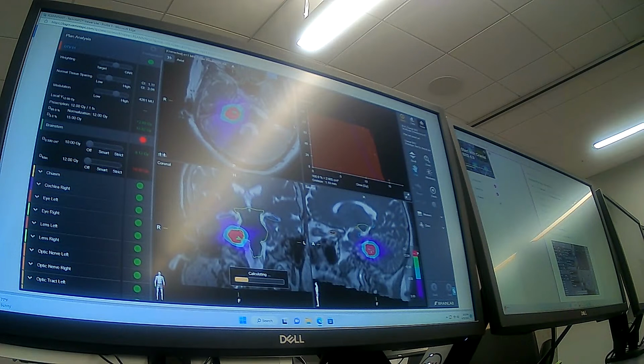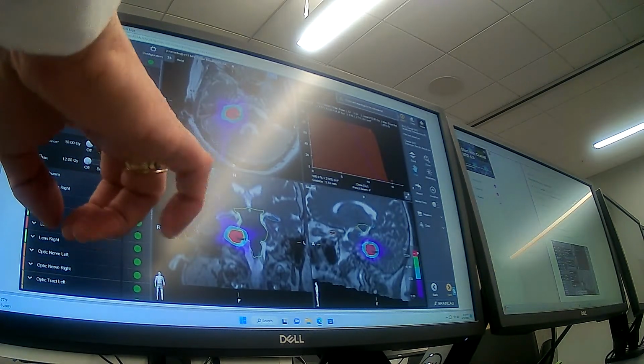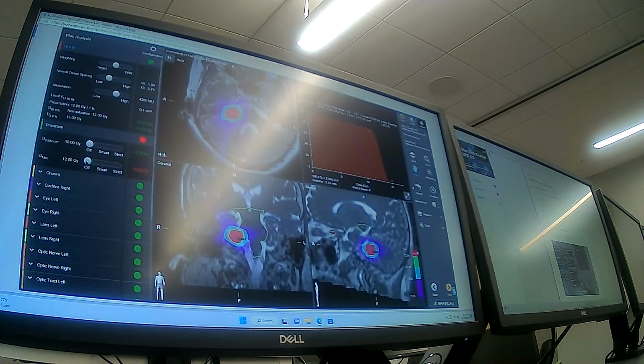I'd be surprised if it wouldn't, because the brainstem is probably the most important part, that's close to the GTV anyway. Yeah. So now it meets it. The only thing, even with those off, is this, and it's too great. So suddenly it met all the parameters except that one spot.